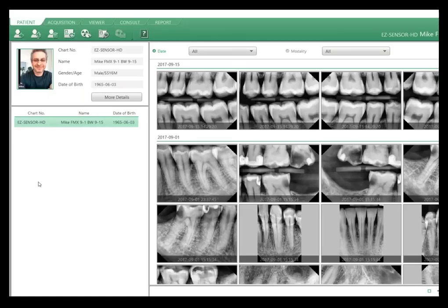Jim, anything you want to add about the editor there? No, I think, Paul, you covered it all. The nice thing about it is you can create mounts per team member with different workflows, you know, vertical bite wings with the 1.5s, 18 FMX, and also with the cameras. With our camera, which we're not showing today, you can do that with your camera mounts there.